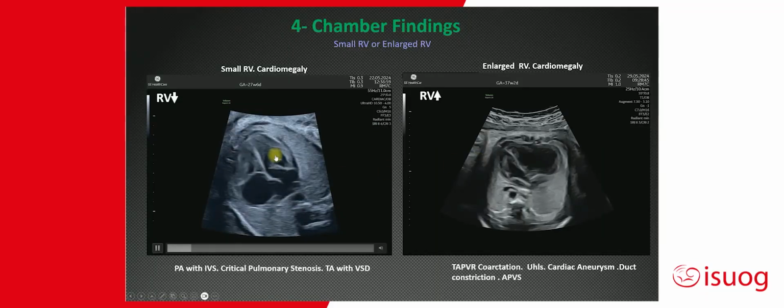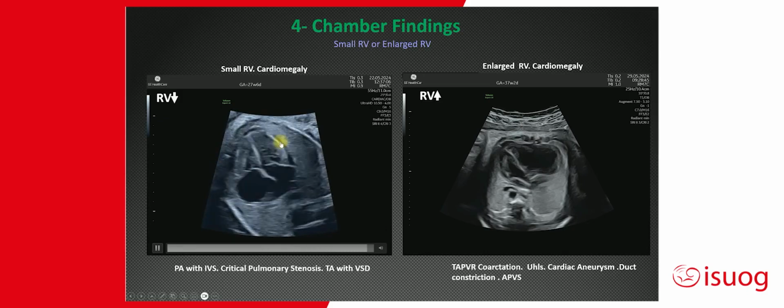Next, we move on to this case of a 4-chamber view of the heart, and we look at the size of the heart. The cardiothoracic ratio should be less than 50% according to the ISUOG guidelines, and you can see, in fact, this is more subjectively 60%, but you measure the circumference of the heart to the circumference of the chest.